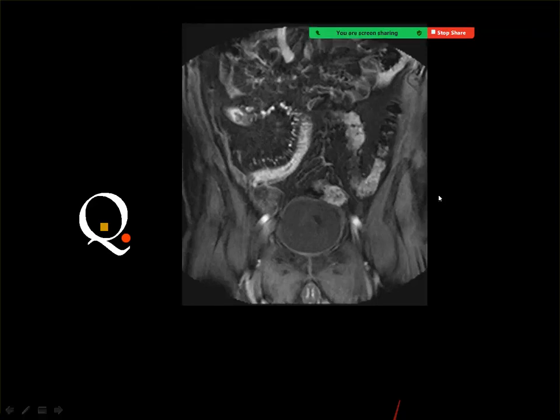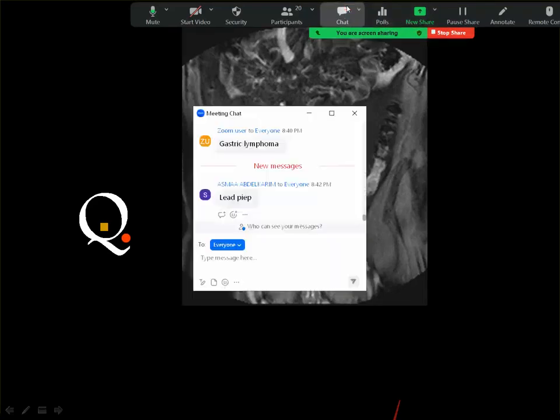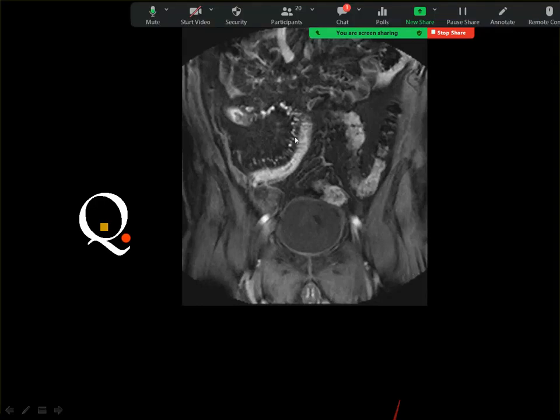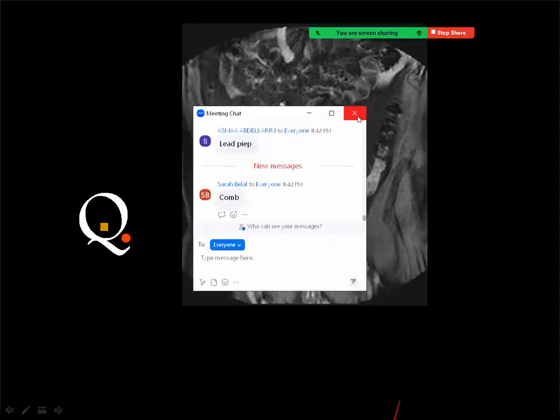Okay, I have mentioned in the recent lecture that one of the diagnostic criteria of Crohn's disease is the comb sign. And this comb sign is the result of dilated vasa recta vessels along the mesenteric border of the affected loop. And this is one of the best diagnostic signs of active or acute Crohn's disease, known as the comb sign.